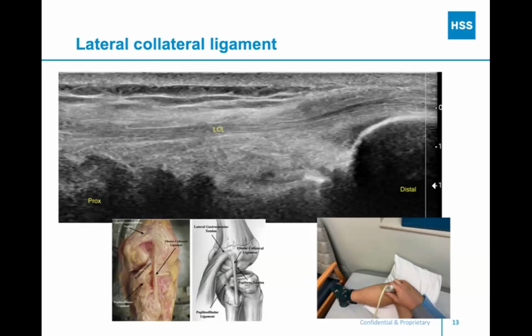And then when we talk about the parameniscal cyst, which you covered really well, I think it's really important to get orthogonal imaging on that. And so I could have missed it, but I saw kind of a long view along the meniscus with it, but not a transverse view of that. So we want to get measurements of those structures. I think it is very important to look at hypervascularity within these structures. Not all cystic structures are cysts. And so using our power Doppler imaging or SMI or whatever you have on the system that you have is appropriate, just making sure that there isn't anything abnormal associated with these.